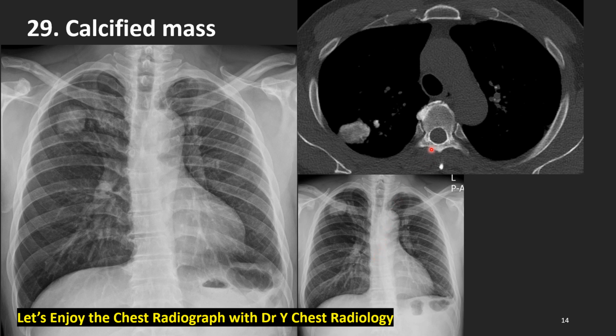On his actual non-contrast enhanced CT, we find these calcified mass, calcified nodule, and several calcified nodules on the left side too. And this is a stable tuberculosis with calcified mass form.